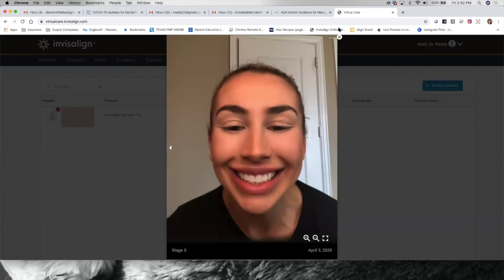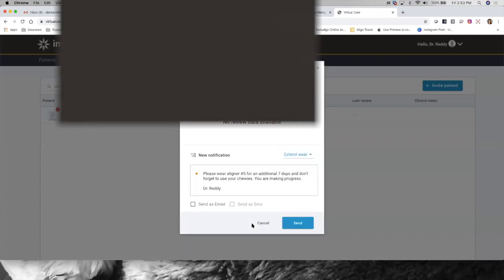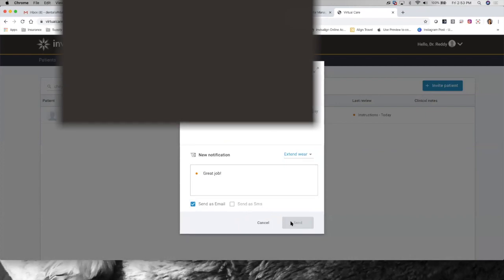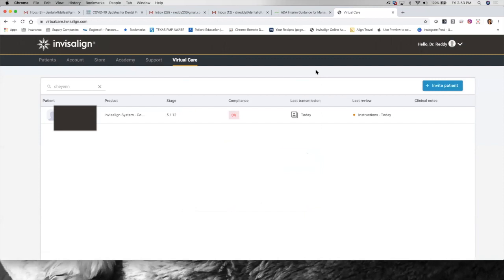Awesome. And then I can send instructions back to you. And they'll come by email. Oh, I just got it. It popped up on my app and it said, great job, because I am simply the best patient ever. Oh, okay, awesome. So it's really pretty simple to use.